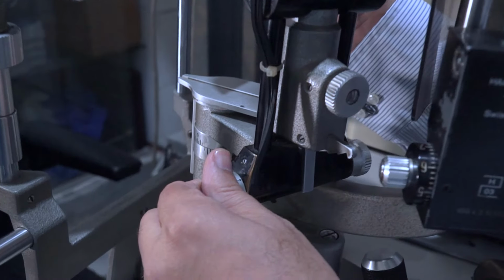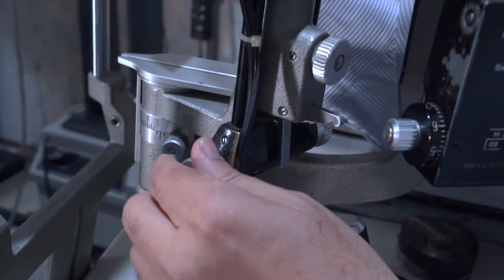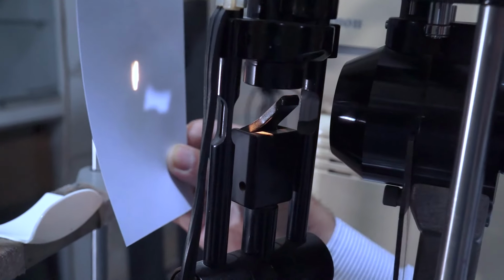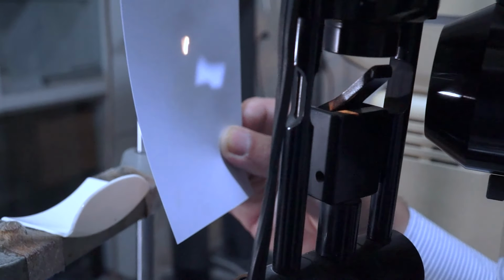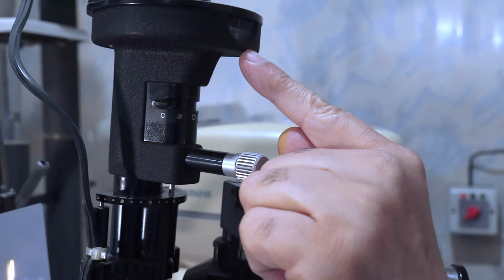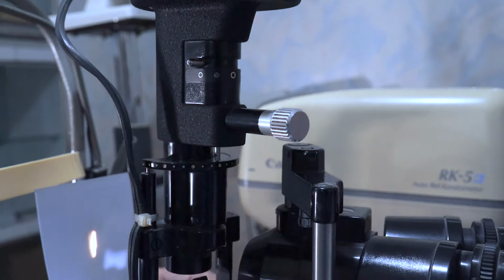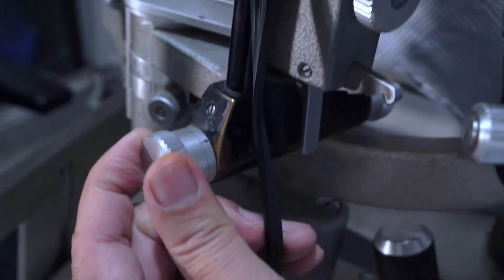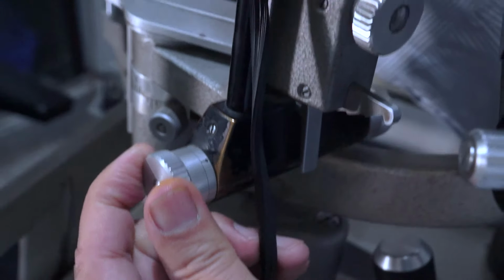So you can make a slit of this. It has got a height and a width. So you can change the width of the slit as well as the height of the slit, and at the same time you can measure this height. There is a scale over there, and from this scale you can measure in millimeters the height of the slit, and from here you can check the width of the slit. So this is the 0 1, and then this is becoming wider and wider.